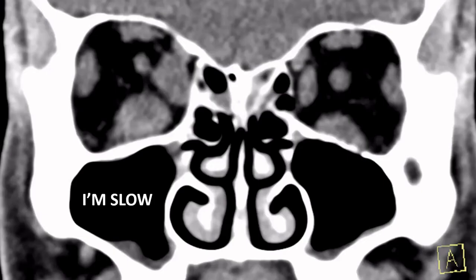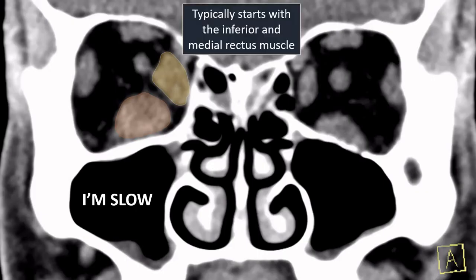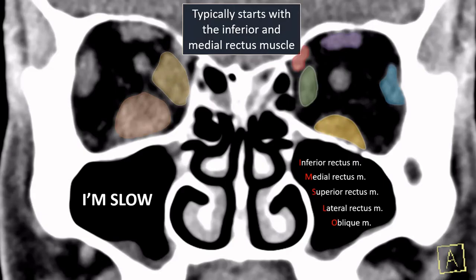Furthermore, if you look at the coronal image, you see that two muscles are involved on the right side, the medial and the inferior rectus muscle. Well, I first showed you the inferior, then the medial. And that's also no coincidence, because in thyroid eye disease, it has been shown that the disease typically tends to start at the level of the inferior rectus muscle, followed by the medial rectus muscle, and then it has the following appearance of frequency. Mostly involved is the inferior rectus muscle, followed by the medial rectus muscle, and then the superior rectus muscle, the lateral rectus muscle, and the oblique muscles.